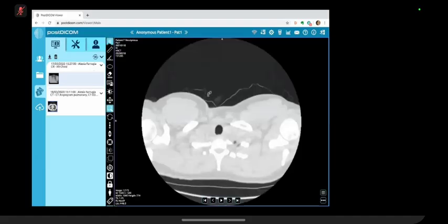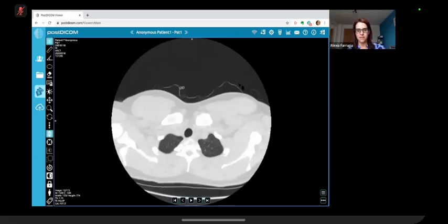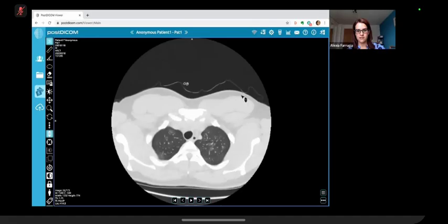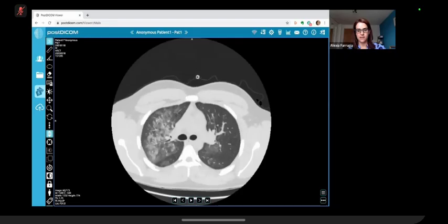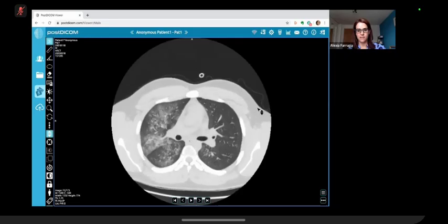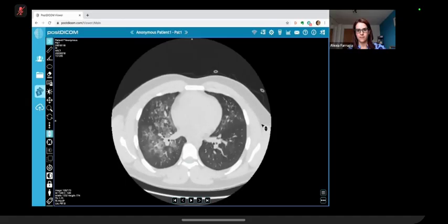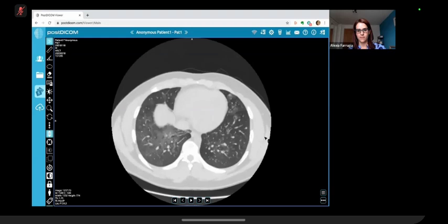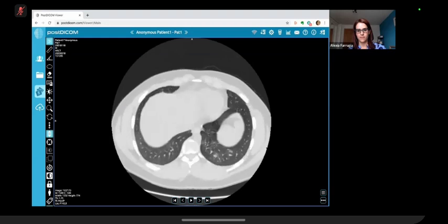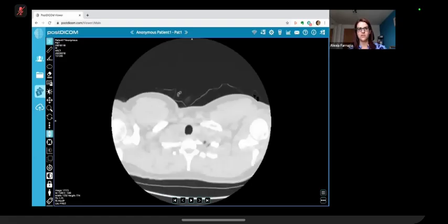Great. So we did a CT. Focus on the lungs. I will scroll through slowly. And whenever you're ready, just describe.